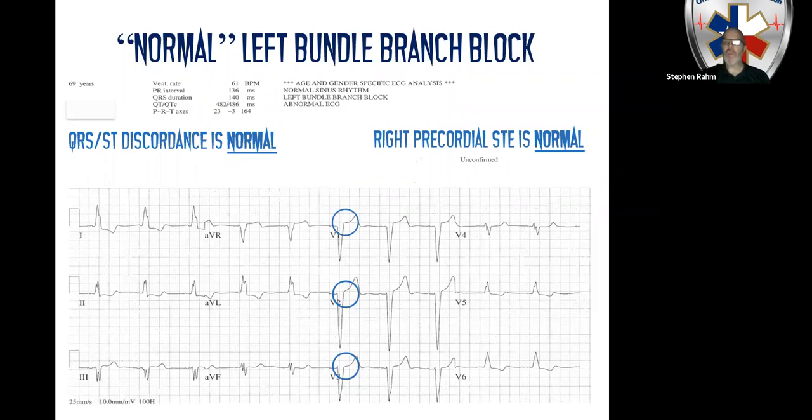And this is where some paramedics fall into that trap of looking at those three leads in a patient who's having chest pain, and they say, oh, well, there's ST elevation. This meets our heart alert criteria because it's greater than 1 millimeter. So I'm going to go ahead and pull the trigger and call in the heart alert. Just remember that left bundle branch block is not in and of itself a STEMI equivalent. It used to be years ago, but it is no longer a STEMI equivalent.